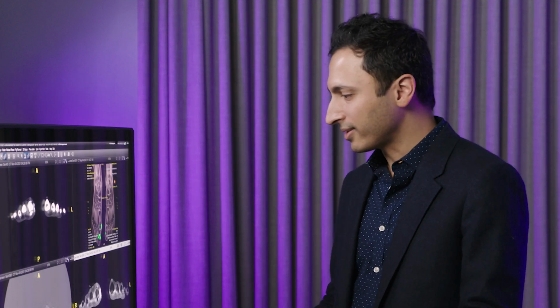So to recap, I think gout evaluation is a very easy application for GSI at any institution. Hopefully I showed you that today. And again, the only real pitfalls are to make sure to look around tendons as well as joint spaces, and don't overcall nail bed artifact as gouty deposition. And that's how I do gout imaging with GSI.